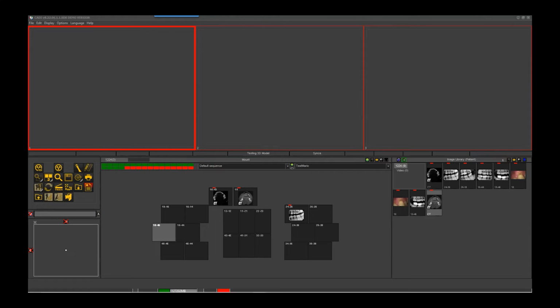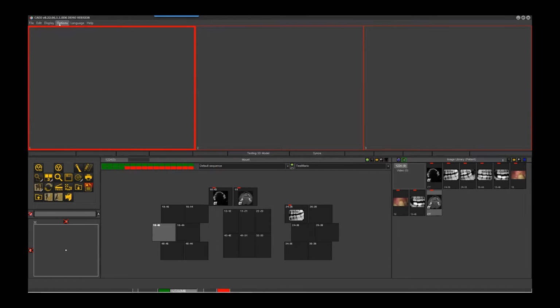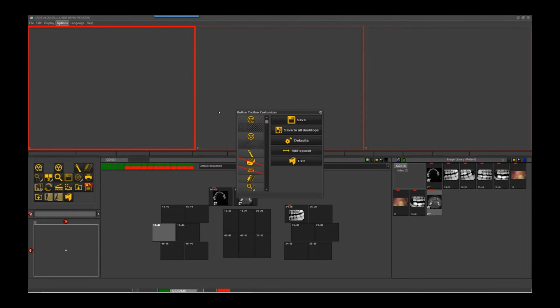We have modules on that if you're interested. I believe I mentioned that earlier. Mari, is that something we can show her? We can show her fairly quick. Yes, let me see if it's installed in this version.